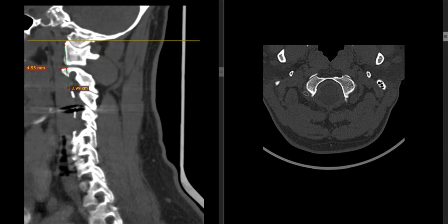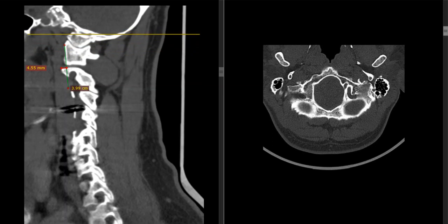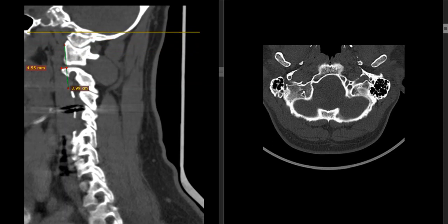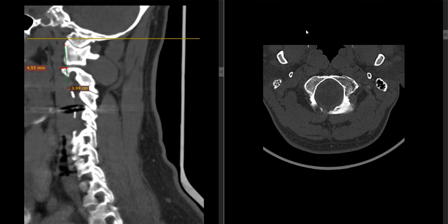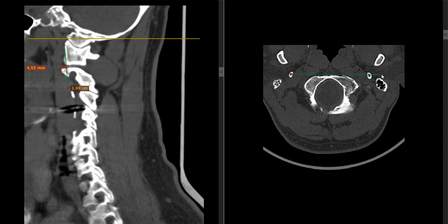So here, I'm going to take a guess at it right now. So here's the styloids, and if I were to just judge it based on if this is center, I'm going to create a skull angle of where your skull is facing based on these numbers. So if I can get this right to a 90 degree. Alright, so now I can copy this.